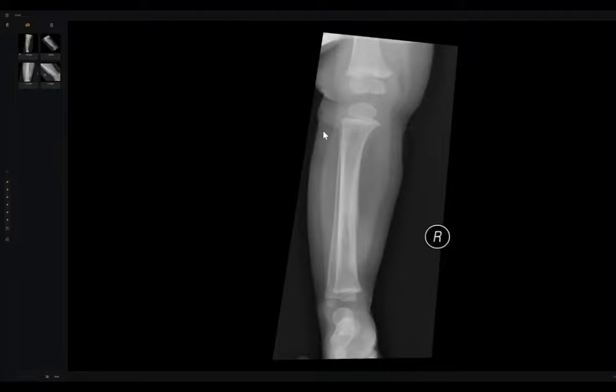Doctor, take care. This is the same patient with leptomeningeal enhancement. Okay, sir, there is a lytic lesion with a wide zone of transition in the mid part of the tibia with periosteal reaction. This could be the primary, or this could be part of the metastasis. What is your next step? Sir, I would like to see the MRI of this limb if available.